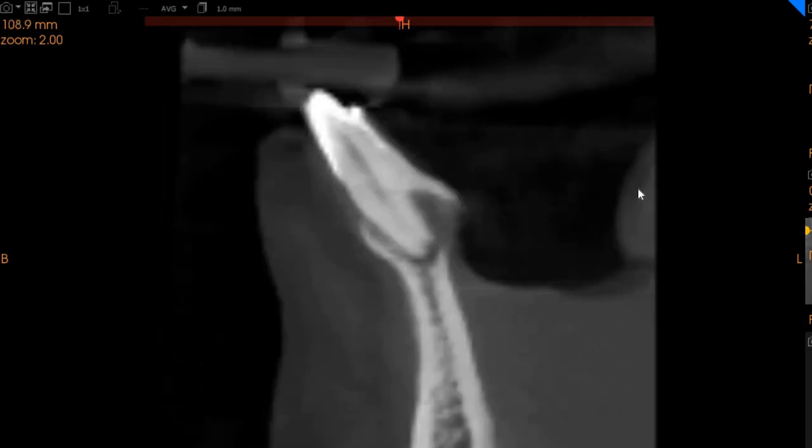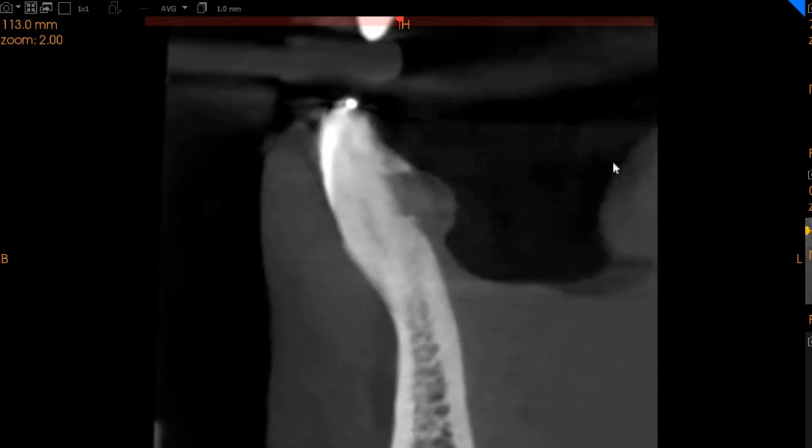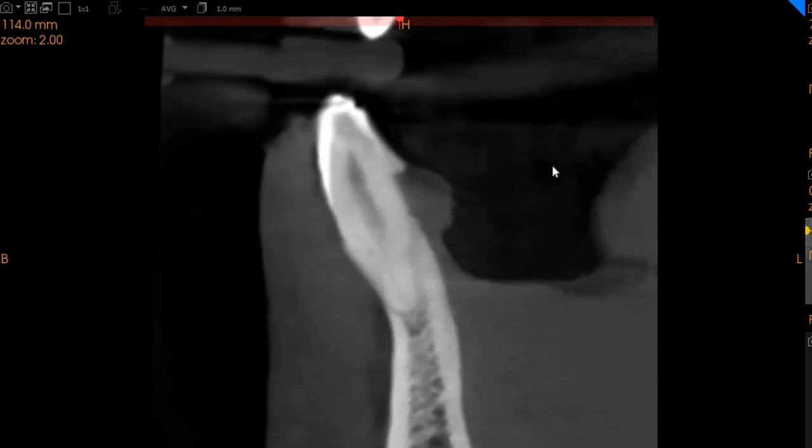And then we move to the canine on the left hand side, and this canine again has minimal bone. This canine has better bone support than the one on the right. It's almost just below the half of the root structure, and lesser calculus can be seen, and this canine has no radiolucency around it, or any significant periodontal ligament widening.